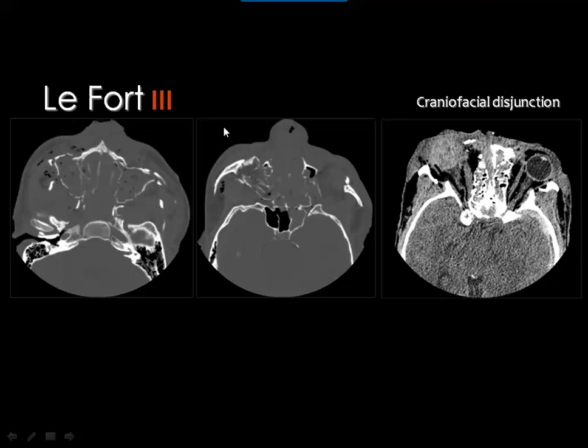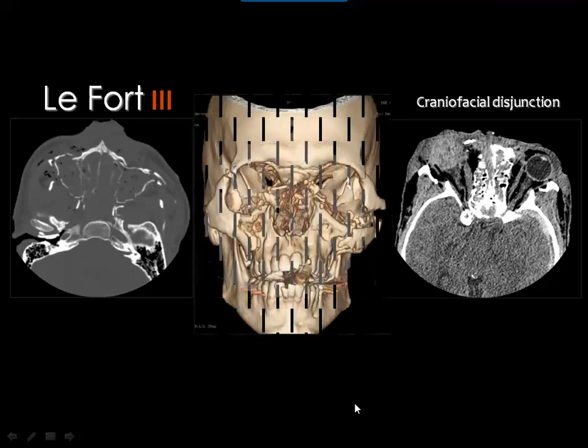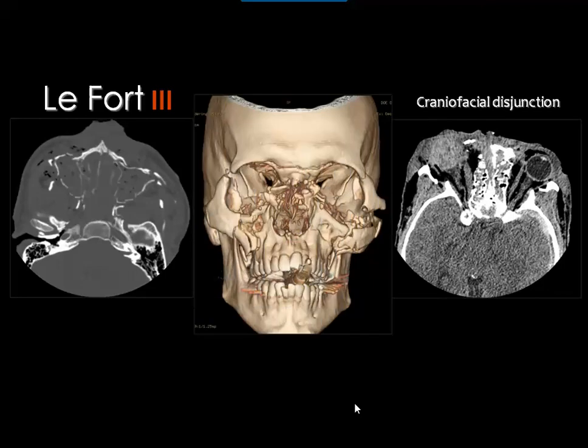And because this is an extensive injury, it may be associated with globe ruptures. And this globe is intact, surrounded by hemorrhage, and this globe is ruptured and is occupied by a hematoma. And this is the bone window to appreciate the fracture and its distribution.